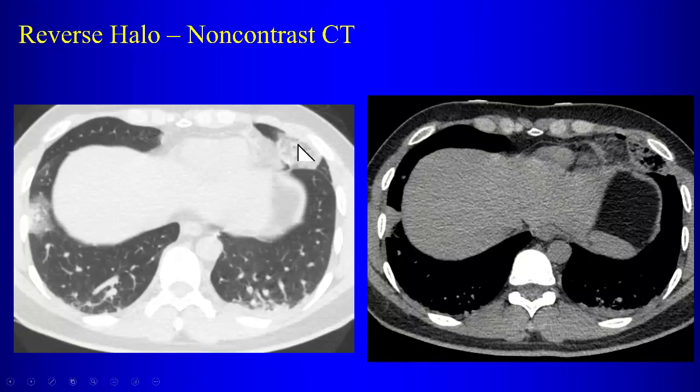Yeah, that means there's ground glass inside and consolidation outside, as opposed to the halo sign where there's consolidation inside and the ground glass is the halo around it. Okay?